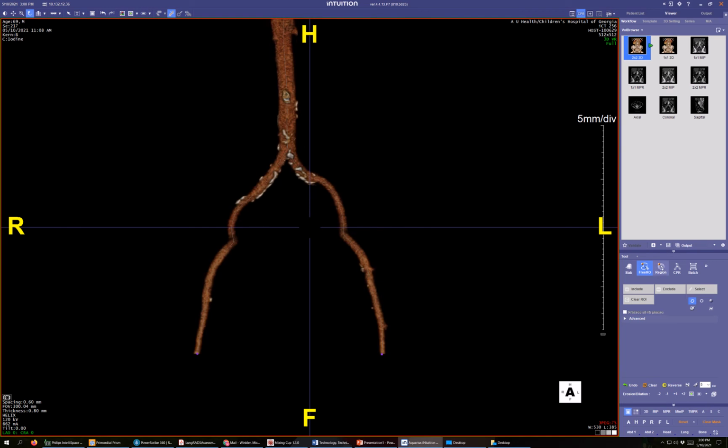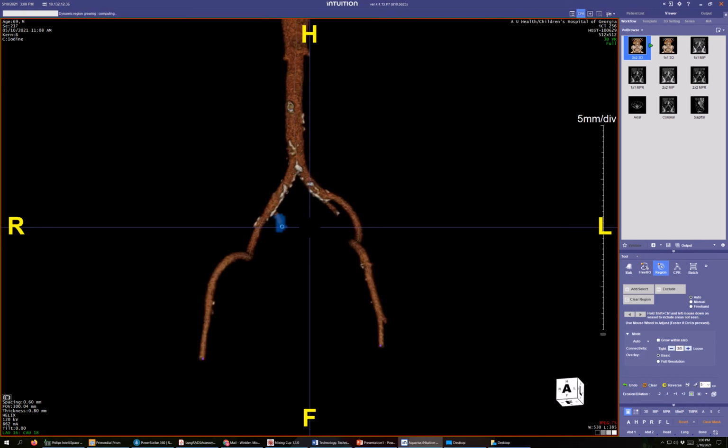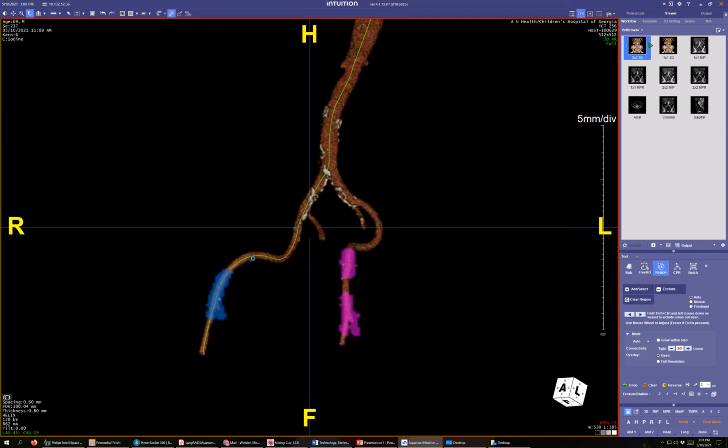It's important with the iliofemoral arteries to show the iliac bifurcation and the femoral artery bifurcation. So just growing a little bit of that in. It's part of how you determine your boundaries. I also like to show a portion of the inferior epigastric artery or circumflex iliac.